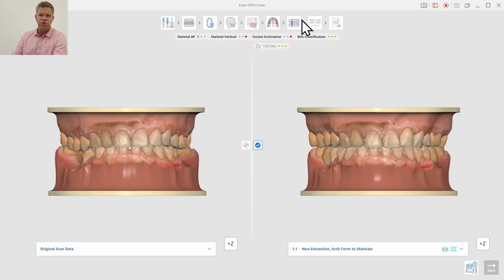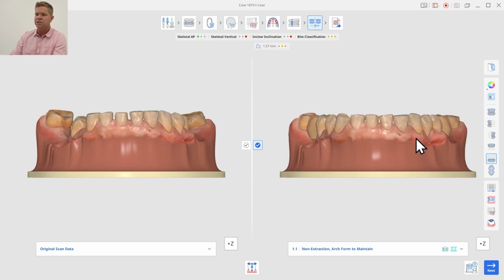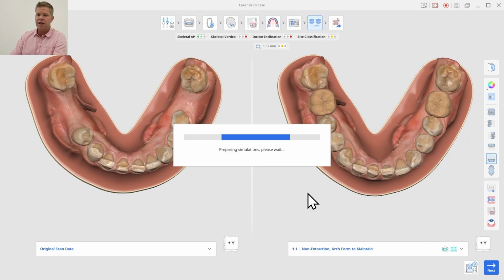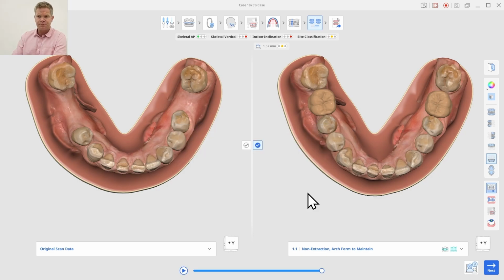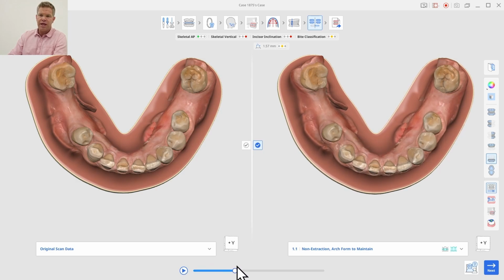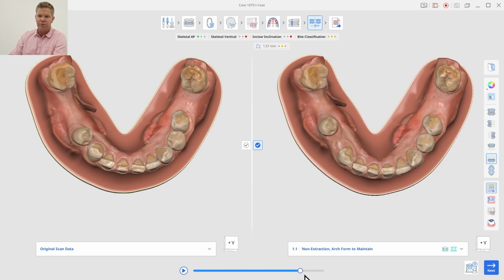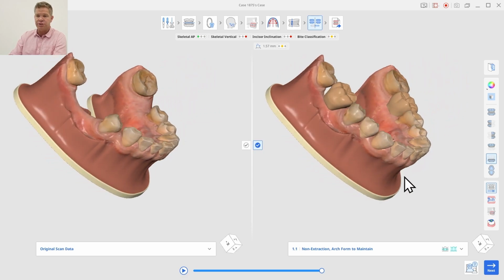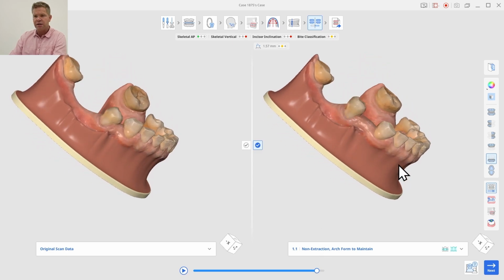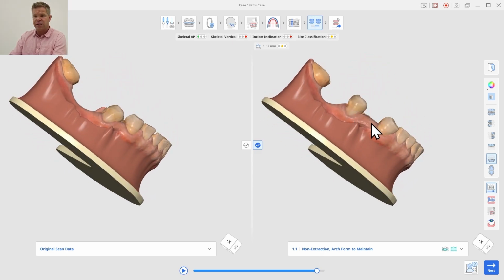One of the beautiful parts about this tool is I can try a lot of different treatment options very quickly to have a very high level discussion with the patient and make better treatment decisions. Again, the animation will help us really visualize this treatment. Now when I go from the start to the finish, if I'm worried about that overjet problem, and if the patient's willing to do orthodontics, by using the anchorage and moving that 4-4 back to the 4-5 space, I'm able to close those spaces on the anteriors, solve some of that overjet issue, and place the implant in a much nicer position. So I can scroll back just a little bit. You can look at, by moving that tooth back, this is a much better place to put that implant.